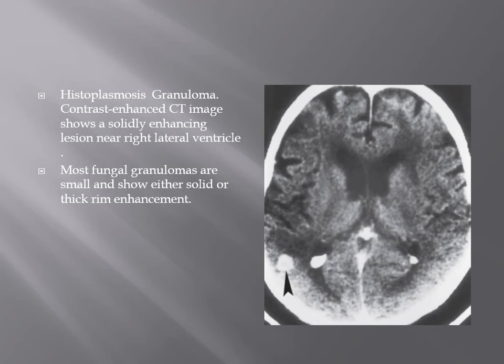In this histoplasmosis granuloma, the contrast enhanced CT image shows a solidly enhanced lesion near the right lateral ventricle. Most fungal granulomas are small and show either solid or thick rim enhancement.